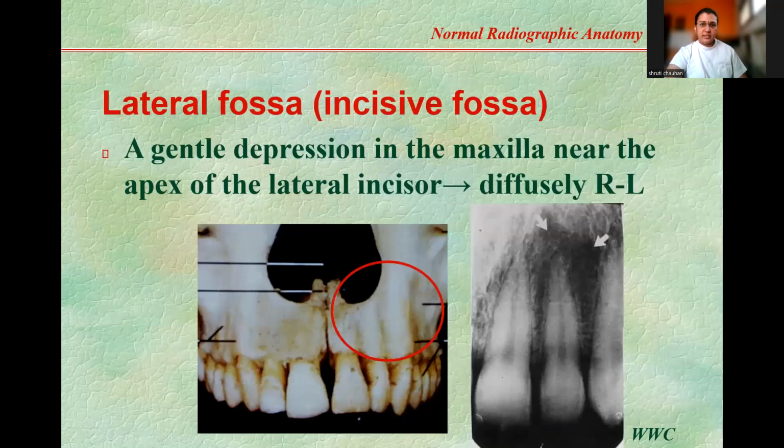Now the next is a fossa, the lateral fossa. Stop reading, first just listen. Lateral fossa. It is lateral. Lateral to what?